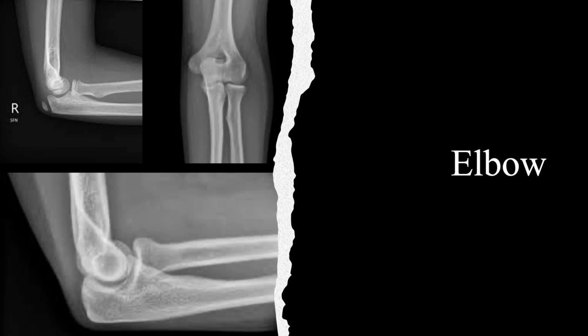So then in pediatrics, you also want to ensure that at least 1/3 of the capitulum is anterior to the anterior humeral line. So here's the anterior humeral line in pediatrics. You want to make sure that at least 1/3 of the capitulum is anterior to that. All right, so another thing to keep a lookout for in pediatrics.